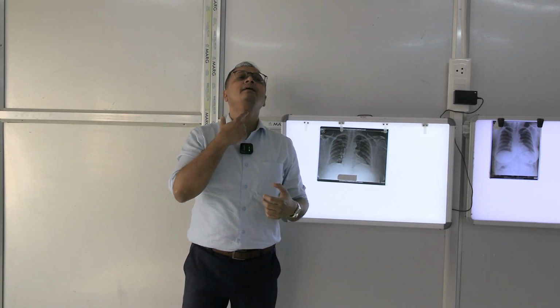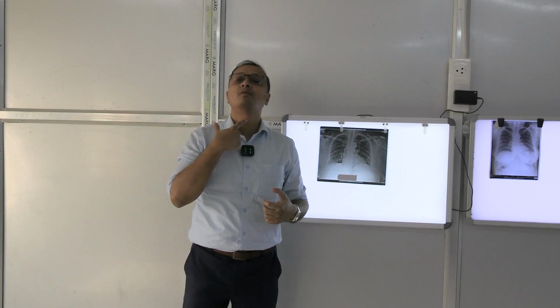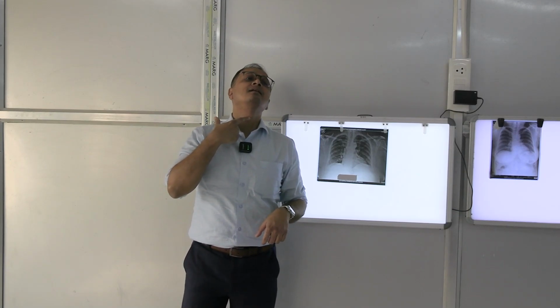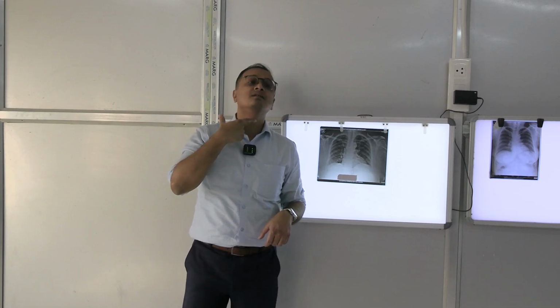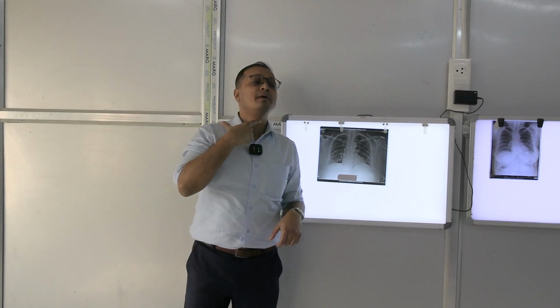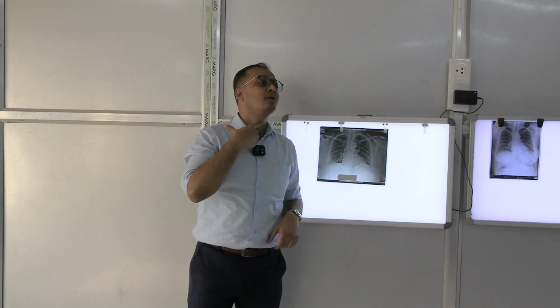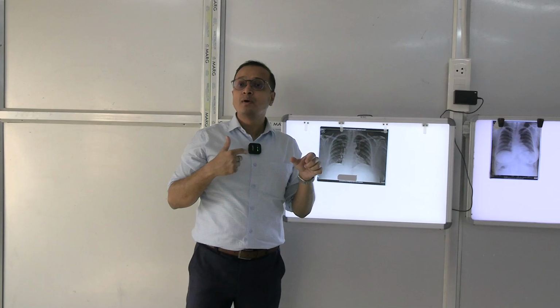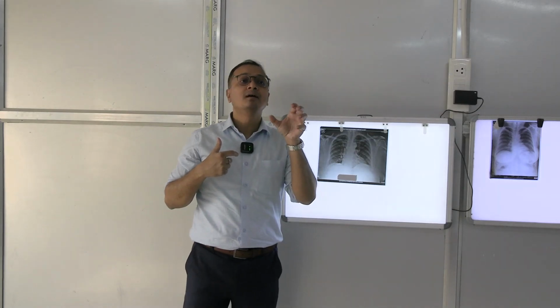This trachea tracks down from the voice box. We have the voice box present here, the larynx, with the laryngeal cartilage prominent over here. So this is our voice box, our larynx. Our sound is produced here. This larynx, or voice box, going down continues as the windpipe or wind tube, the trachea.